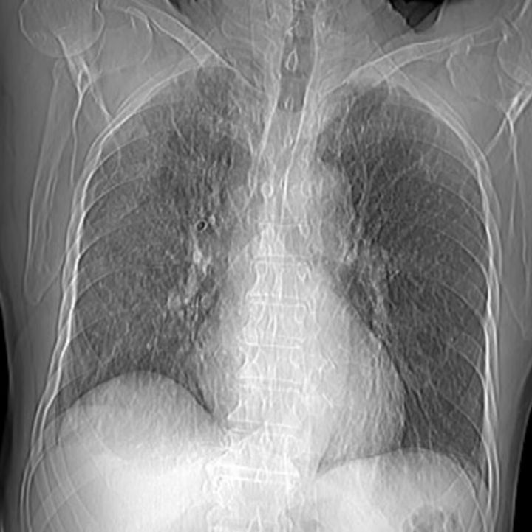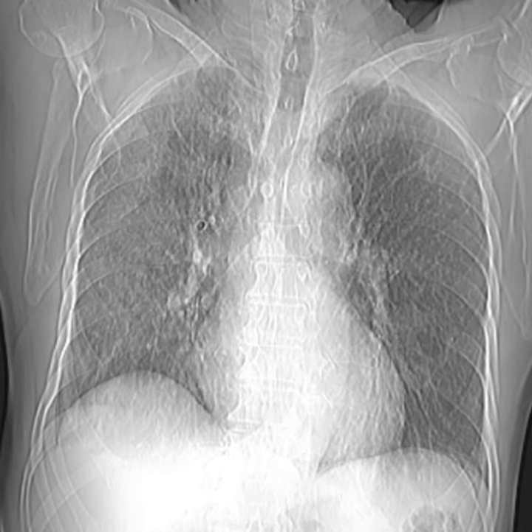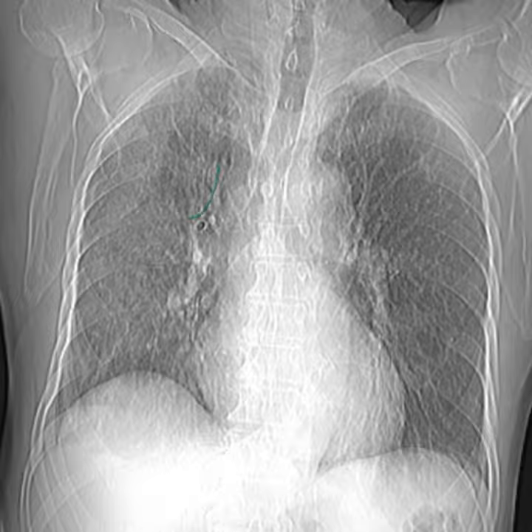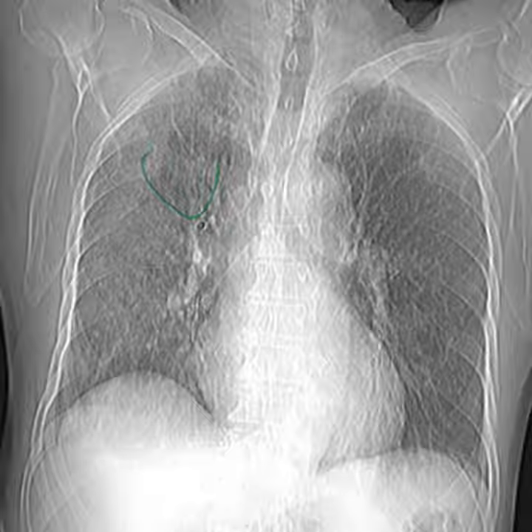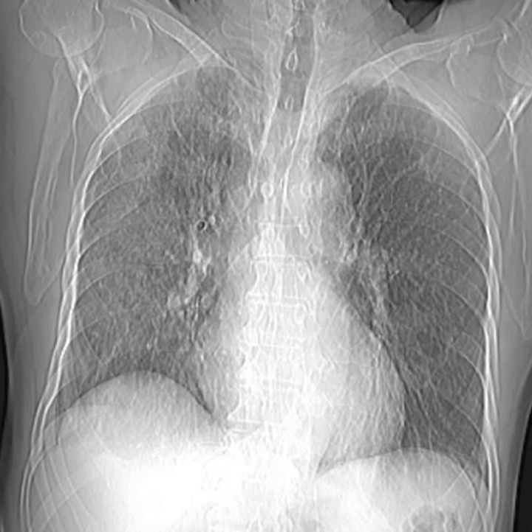Well, on the survey images, it's not very clearly seen, but I think there is some sort of ill-defined area of ground glass opacities, probably here. Maybe something here, I'm not so sure. I would not comment on that, and I would go straight for the chest CT.